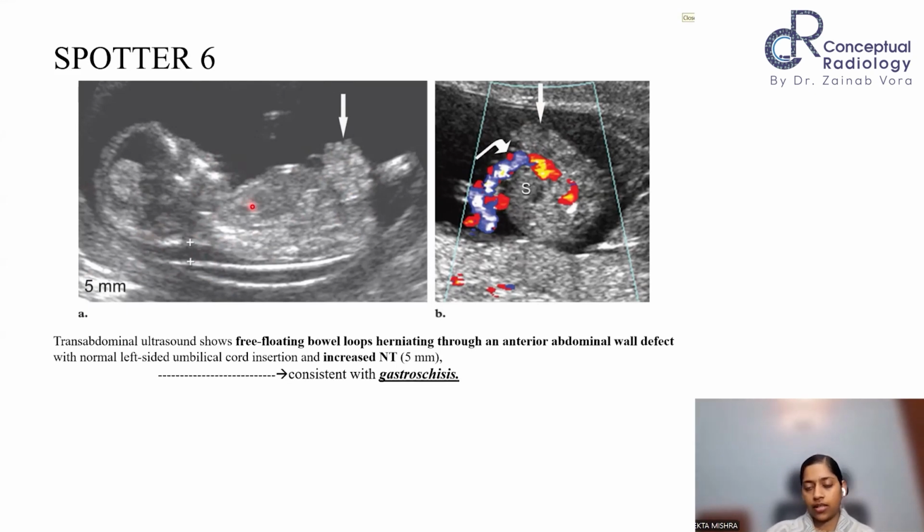Yes, this is gastroschisis. So physiological herniation, omphalocele, and gastroschisis. For physiological herniation, gestation will tell you this is physiological. Even the location, base of the umbilical cord, small structure, before 8 to 10 weeks, you will get that. After that, if you're seeing something which is bulging irregularly, free floating loops, lateral to the umbilical cord, which shows normal insertion, gastroschisis. And if you're having a herniation within a well-defined sac, it's omphalocele.